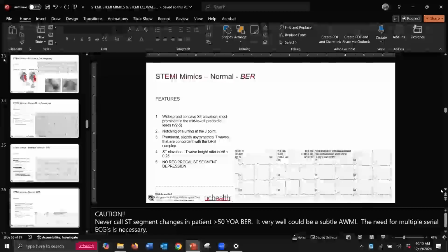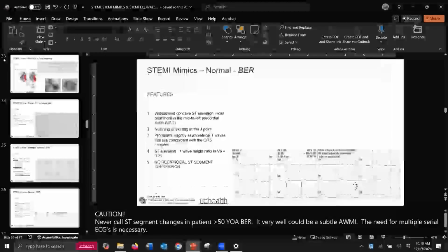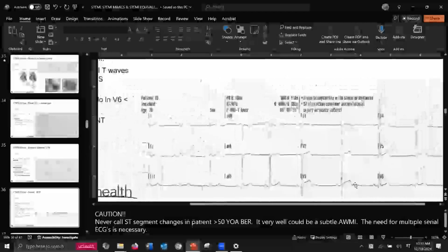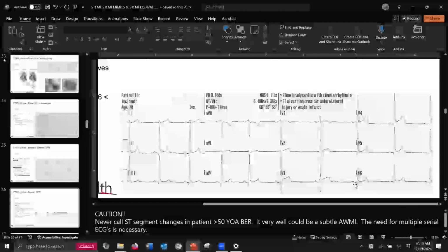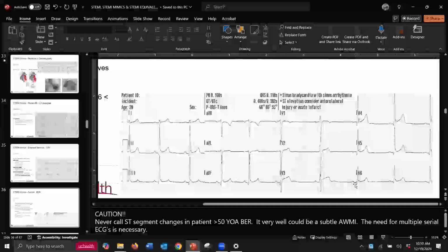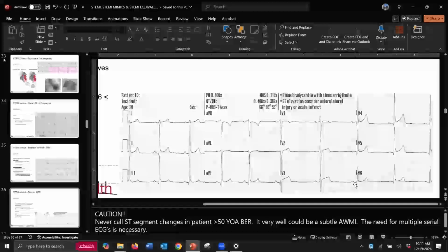Benign early repolarization. Well, there's a couple of things that really make this stand out. We see this ST elevation in more specifically V2 through arguably V5. We see it in 2, maybe not 3. We do in AVF, some in 3. We see a little bit in 1, not really in AVL. It's pretty widespread, isn't it? What's missing out of this EKG to make it meet STEMI criteria?